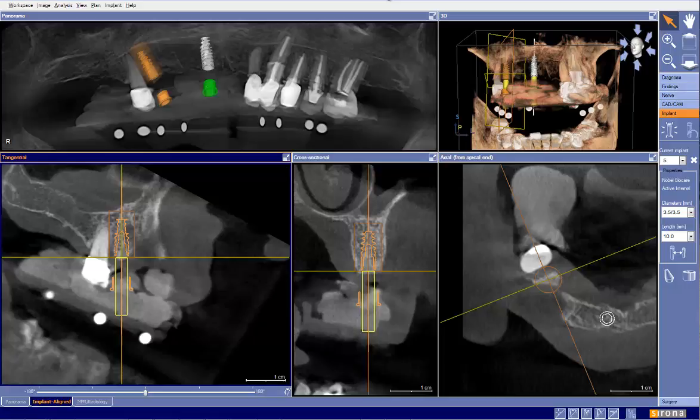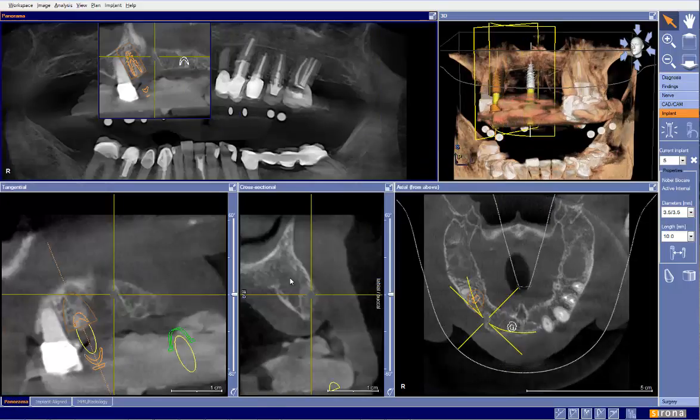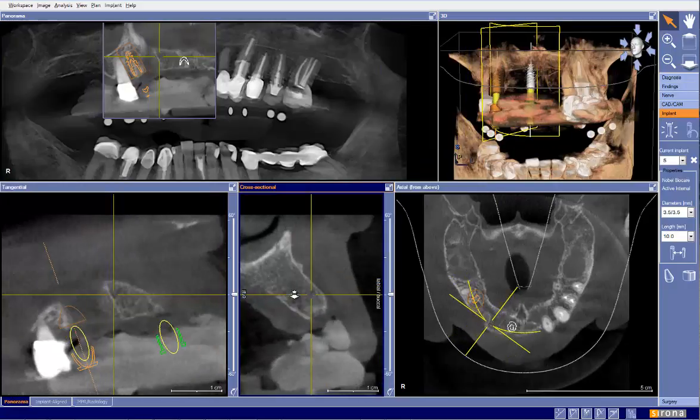How about not placing the implant in the 5-6 region and moving or adding one to the number 9 area? I want to do a partial overdenture with locators for her. She's 88 but in good health. The graft in number 6 site was done in April of 2004 after the buccal plate came out with number 6. So let's take a closer look at that graft in number 6 site.